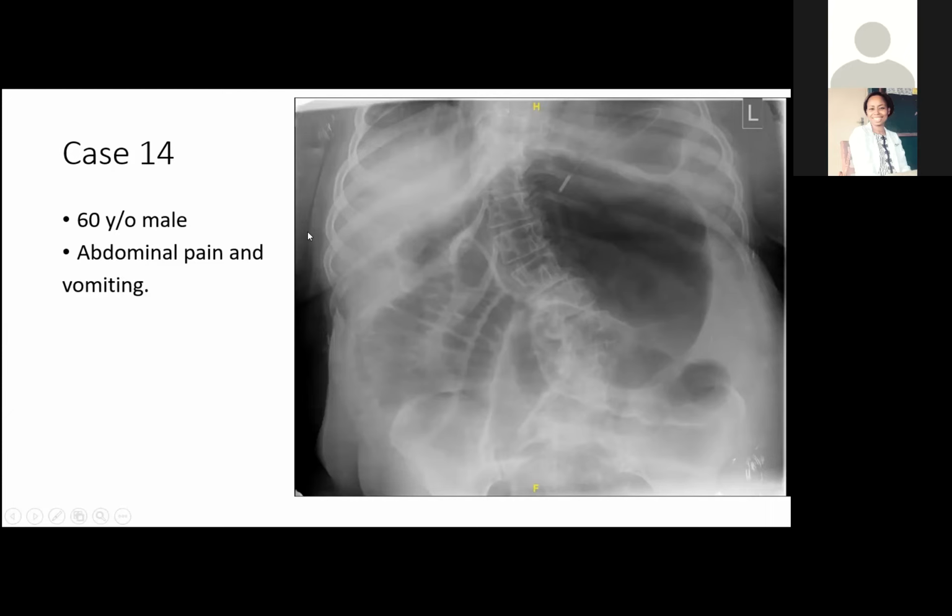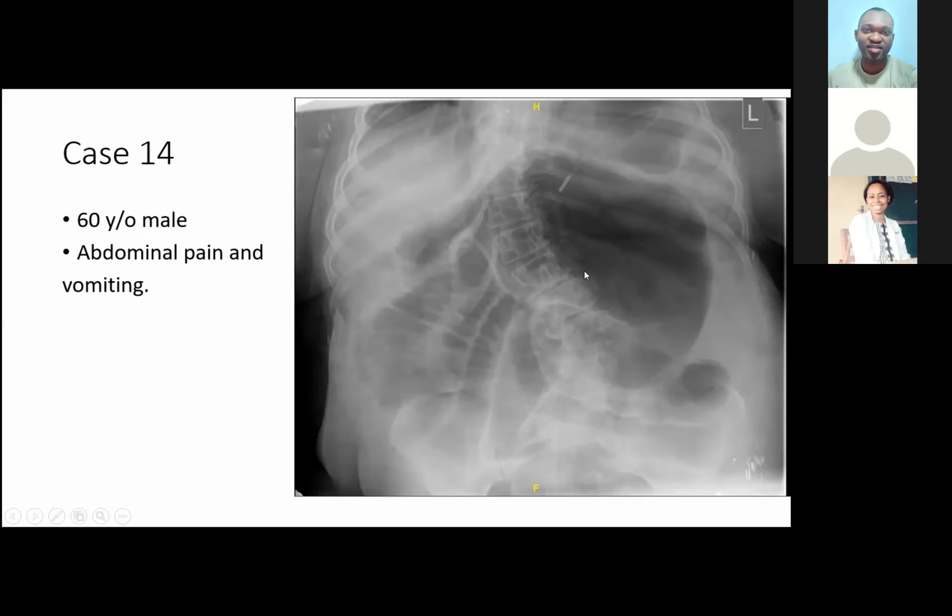Okay. Anybody else have a stab at this? So we have small bowel distension and small bowel obstruction. You did mention this gas-filled structure centrally in the abdomen, and I did also point out that there is a nasogastric tube in situ. So given that, does anybody want to try and tie the findings together?